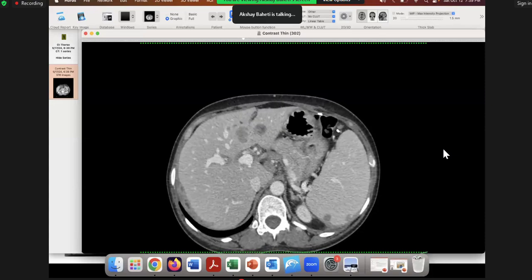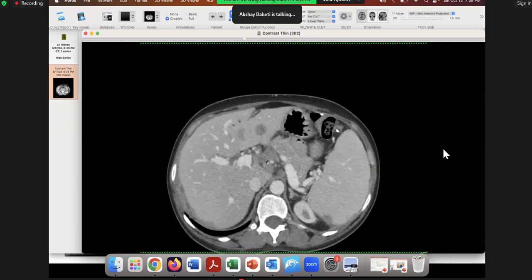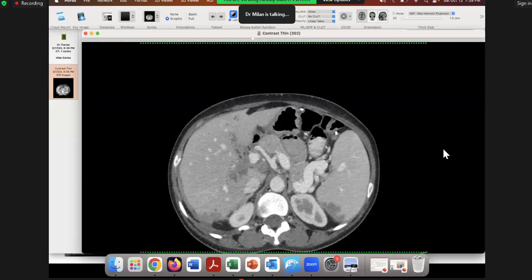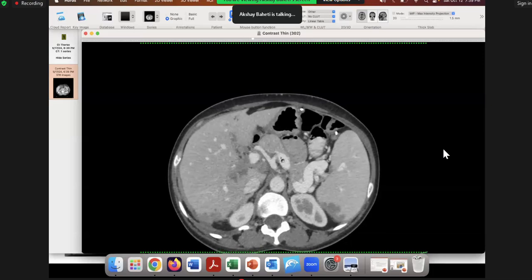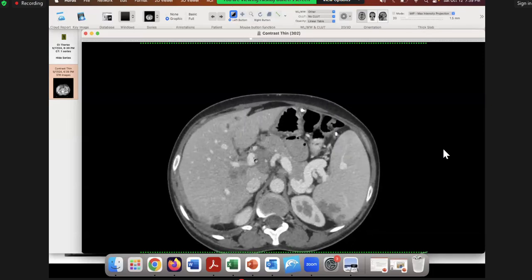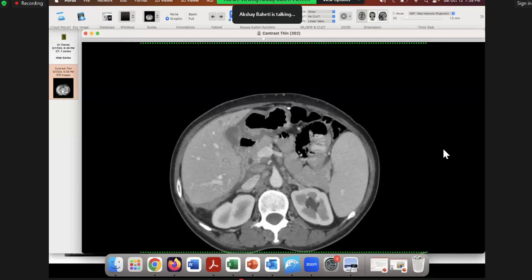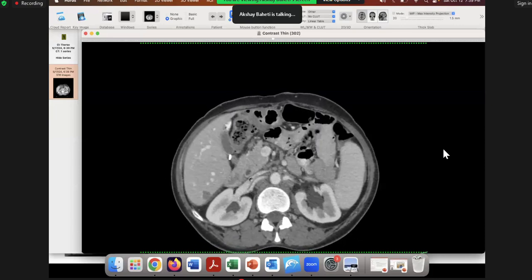spleen. Again, talking of all those sites that we talked about, you can see that this is going to be very difficult to resect. Why? So there is hilar involvement, periportal deposits, and this is much more than the bigger deposits. You can actually see encasement of the main portal vein, can't you? You can see soft tissue all around it, and that's impossible to resect, right? It's extremely difficult. So this one, of course, will go for neoadjuvant.